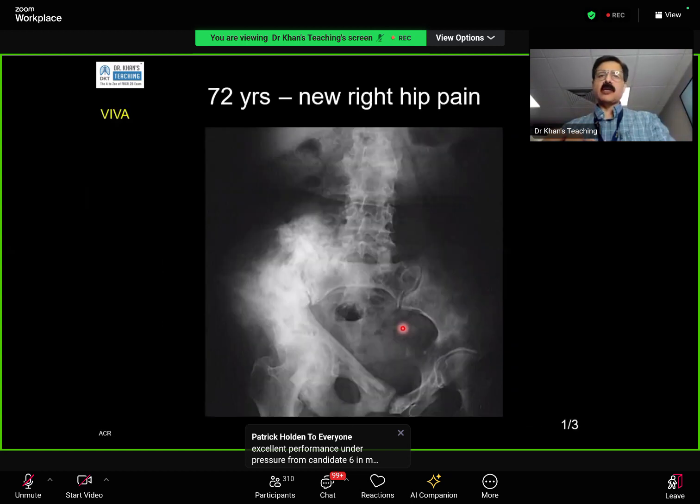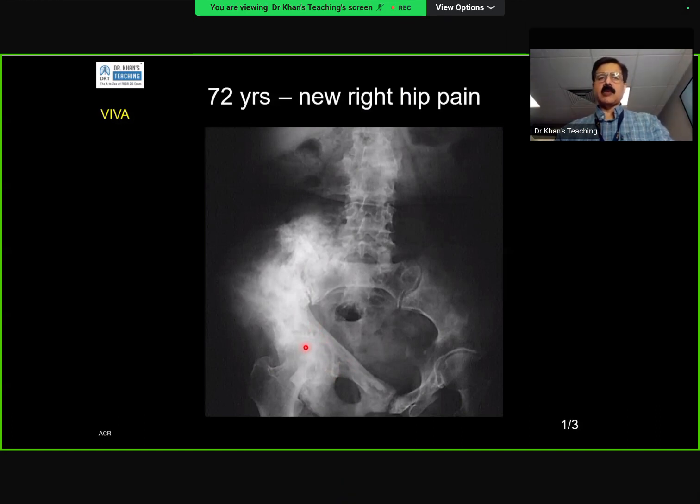Thank you. Excellent. Well done. Now, if you see here, this deformity, etc., is all explainable because of the chronic Paget's disease. On this X-ray, the key finding is here. This is the SI joint, this is the upper portion of the sacrum, the iliac bone. Compare this versus this. There is osseous tissue here, which is abnormal osseous tissue.